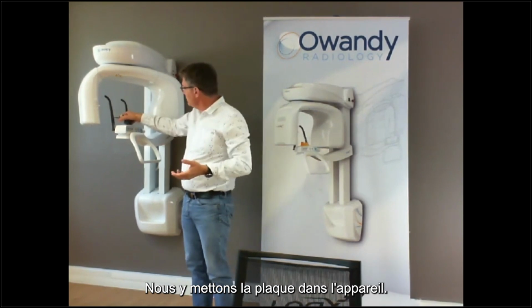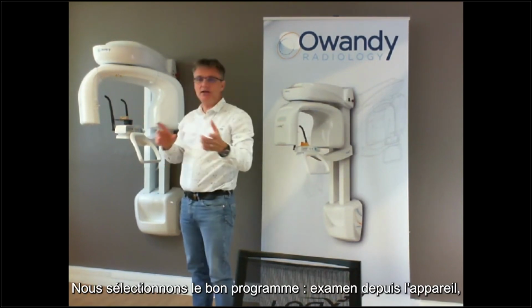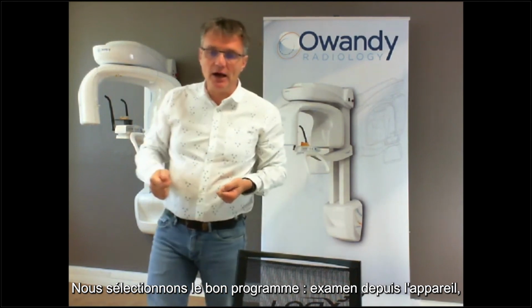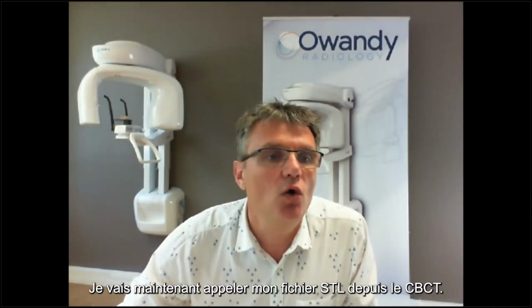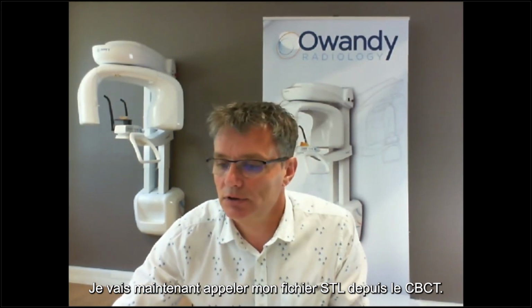We put the plate on the device itself. We select the correct program, exam from the device, and we emit X-ray. And then we retrieve the STL file. Now I will call my STL file from the CBCT.